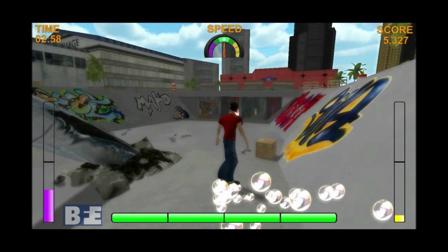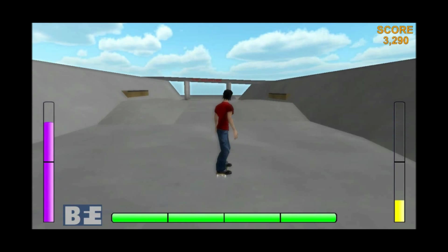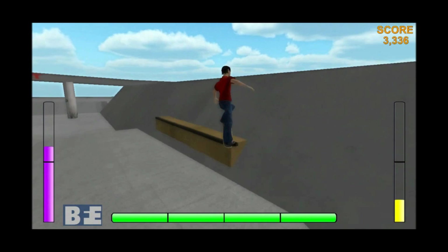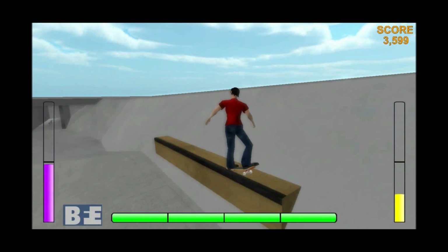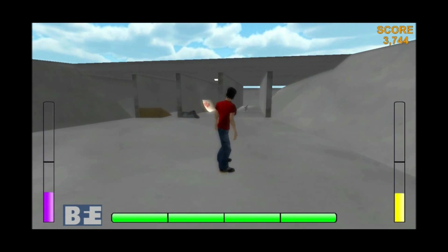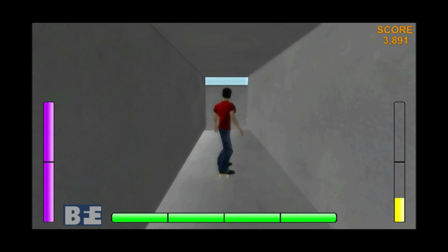By comparison, in the next example, which is coming on, I've turned down these selectable features to almost non-existent. And so I really want you to get the idea that you can really tailor a type of game session for the client. So if you think it might be too intense or too distracting, you can take away a lot of these features and make the game a little bit simpler, less jarring, and essentially a little bit more boring. And so they'll be interested, but just not too artificially interested.